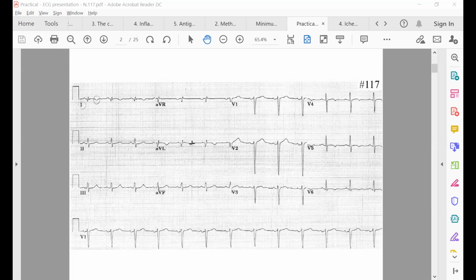Nope. A Q wave and T inversion. Oh, it's an old infarct. Well, subacute. Let's say subacute. Of course, in an old case, you can see any kind of T wave, but let's remember that if it's a subacute Q and T inversion, old one, only the Q wave is represented. Okay, that's fine.